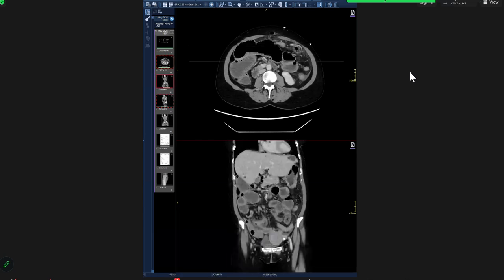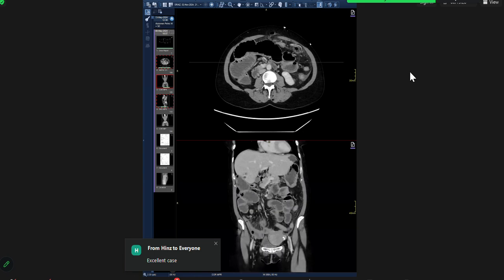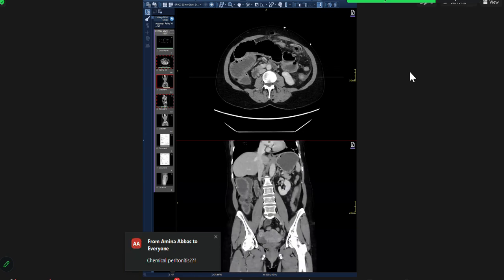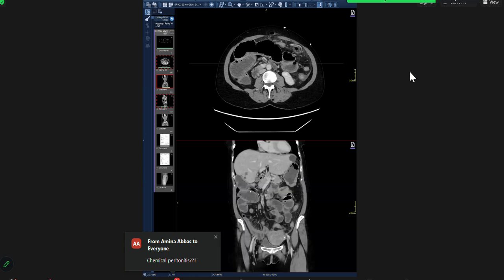They had to take the patient straight away to surgery. Okay. So these are the hints for you to look at when you're managing things. Decide: is it a mechanical bowel obstruction, and what is the cause? Or if there's no transition point, then it's an ileus. Then if it's an ileus, try to search for the cause. Don't forget the free air, don't forget the vessels, okay? Don't forget to look for masses. These would be the main things here.